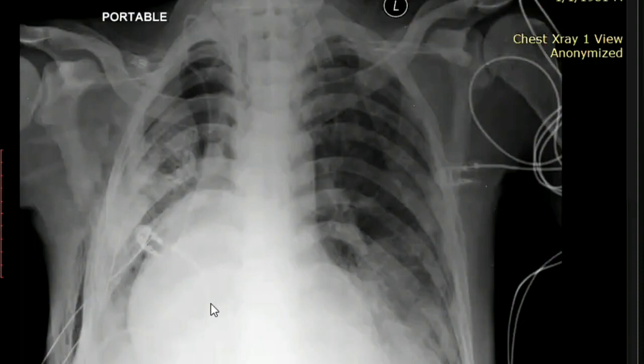Third, these are ECG leads. You can ignore these. And then with all these findings, the bony lesion, again, the key is the same. Look at one scapula and the other scapula and pick the findings. So this was definitely a metastatic lesion.